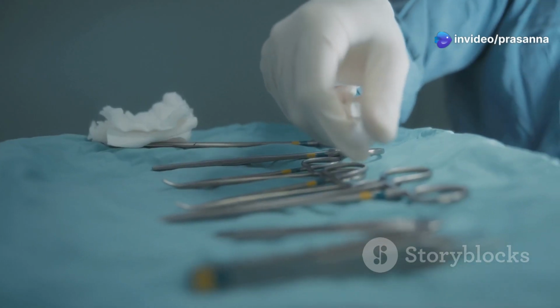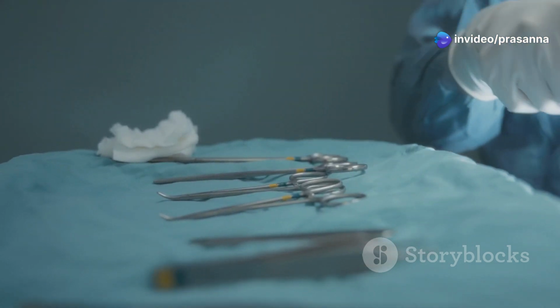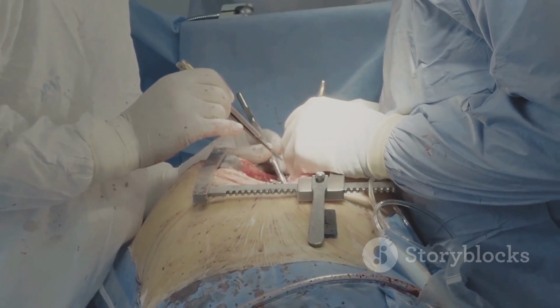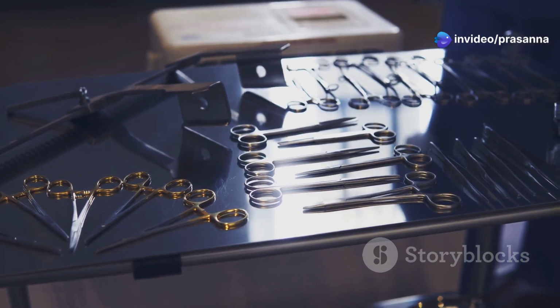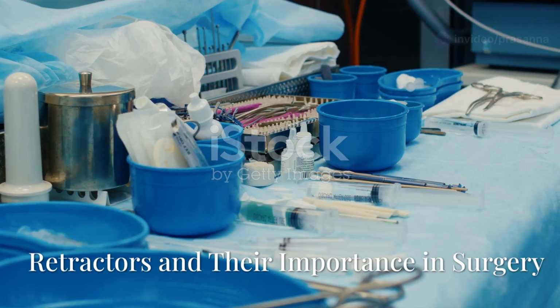For larger vessels, surgeons turn to heavier hemostats such as the Kelly clamp. These clamps have longer jaws and a stronger grip, allowing them to effectively control bleeding from larger arteries or veins. Imagine them as larger, more robust clamps, similar to those used in woodworking but designed for controlling blood flow.